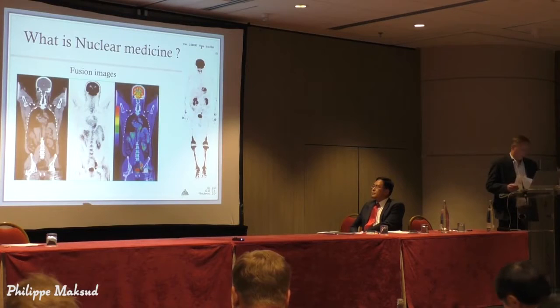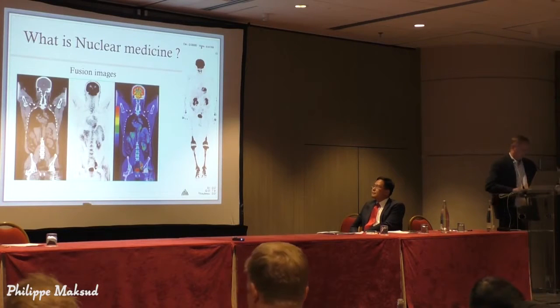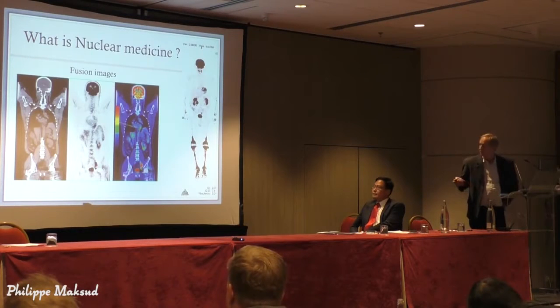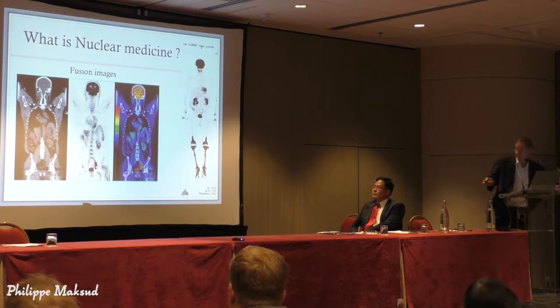The images cover the whole body. At left, you can see the CT image, in the middle, the PET image, and the fusion image.